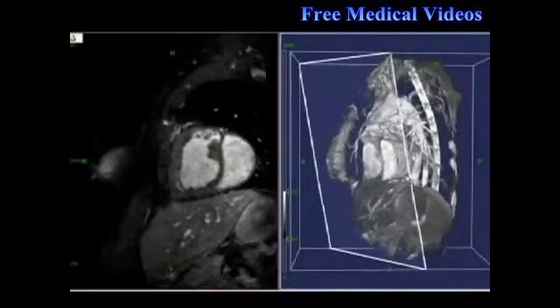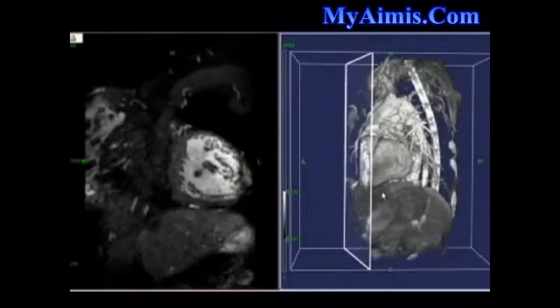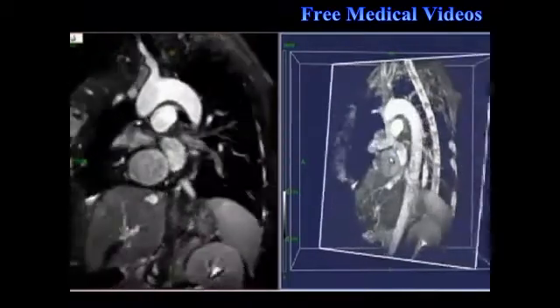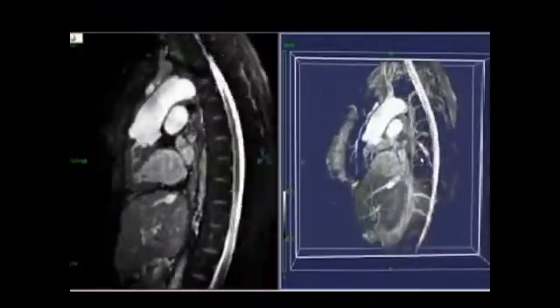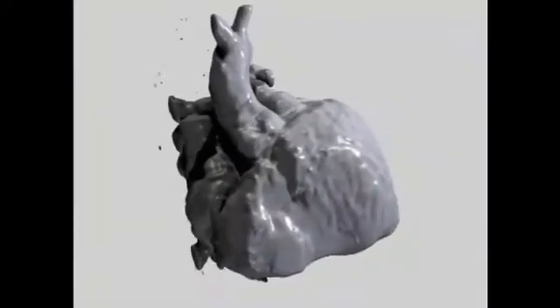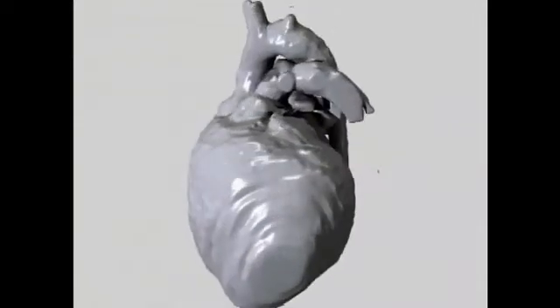On the right, we see a volume rendering of the heart recorded at late diastole. On the left, individual slices from this dataset are reformatted interactively. Guided by the volume rendering, the reformatted slices can be obtained from any angle at any position. From these slices, a morphological diagnosis can be obtained. With some effort, patient-specific three-dimensional models of the heart can be reconstructed from these MRI datasets.